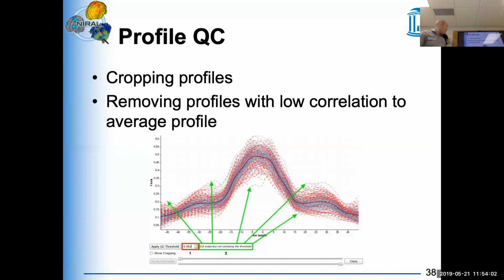In adult data, this threshold is usually around 0.9, because with the high signal-to-noise setting it is usually pretty consistent. Now, in infant data, that's not the case. In infant data, because of the low SNR, you get into areas down here where the signal and noise are similar, so you have so much noise that the correlation quickly breaks down.